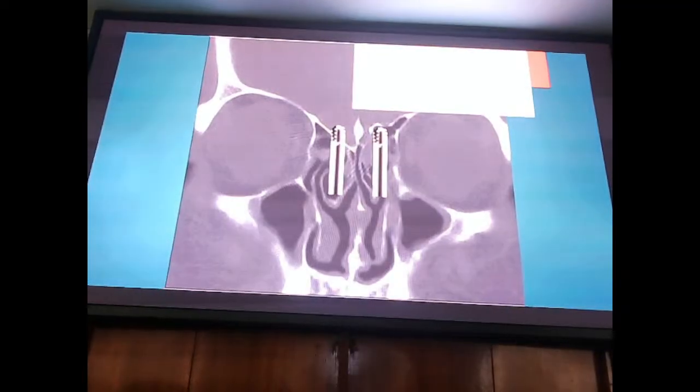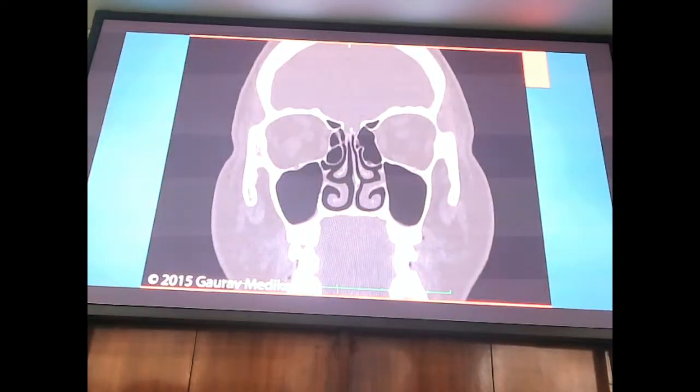So documenting the skull base asymmetry again, that is the reason why I make my fellows write this form every single time. If you do this on 100 CT scans, then at the back of your mind you know what to look for. So that becomes easier for you also, and you will not miss it.